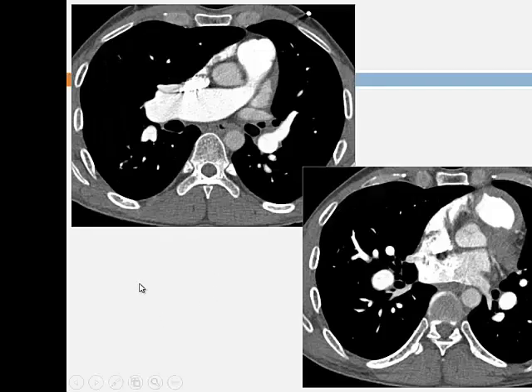Okay, so there are other congenital anomalies that you need to keep an eye out for. I've already mentioned the anomalous pulmonary venous drainage. Do you remember which is the commonest anomalous pulmonary venous drainage? Just the right upper lobe pulmonary venous drainage, and you look to see if anything joins into the SVC. So here you can see the SVC. Obviously the pulmonary arteries are big, and you can see there's a vessel draining into the SVC here. So that's anomalous venous drainage. What's it associated with?